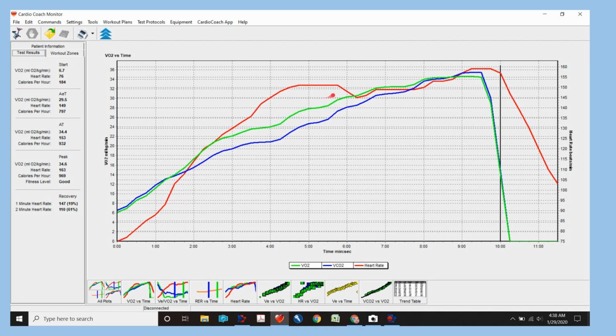So that type of heart rate that is accelerated like that in a test will force a plateau and will also throw off the VO2 score. The patient did very good, but probably would have had a better score. So this particular gradient should come up much slower, much more angled, more consistent through the test. We have a protocol for that, but it doesn't look like it was used here.